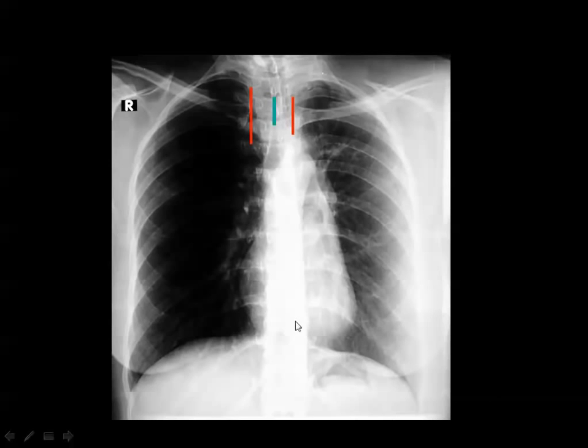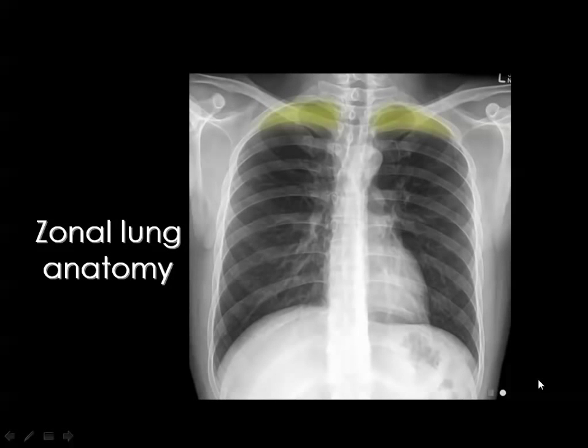Because of this rotation, one of the lungs is hypertranslucent and one of the lungs is veiled, because one of the lungs is closer to the film than the opposite lung. And before misinterpreting this as emphysema or this as pneumonia, you should look carefully for the patient position.